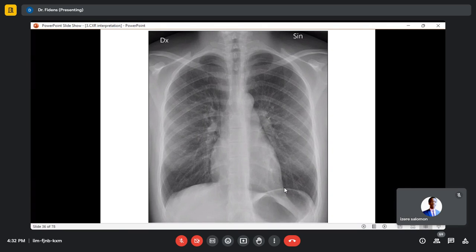After the mediastinum at the center, you go to the lungs. From the mediastinum to the lungs, you cannot pass without a door or a window. A window is not a step, but you should check it. It is the hilum. You don't jump from the mediastinum to the lungs without checking the hilum.